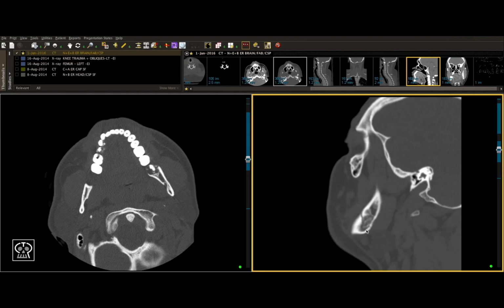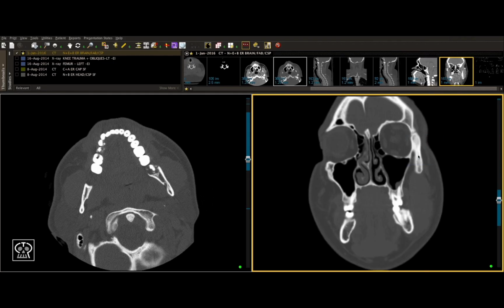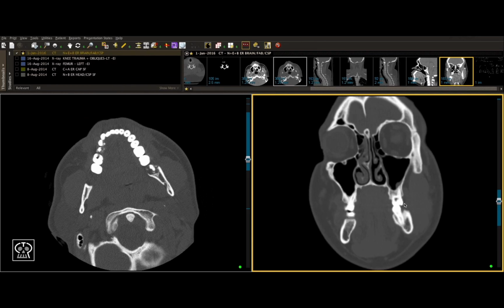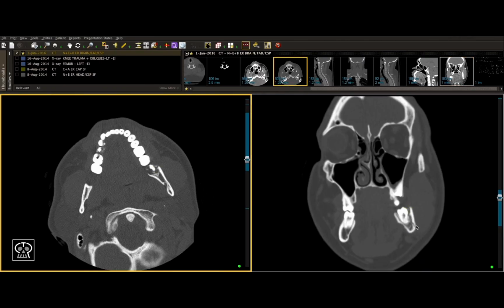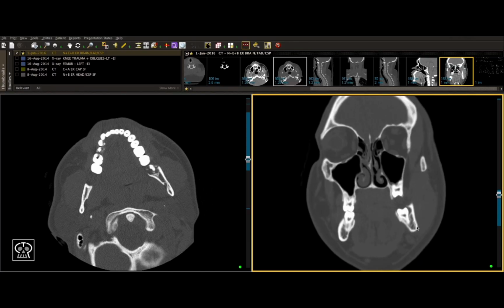The reason I bring up this example is although it becomes obvious in multiple views, you can tell that this fracture is more subtle than the previous ones we've seen. That's why it's so important to always be careful to look for these breaks in cortices and look at the fractures from multiple views always.